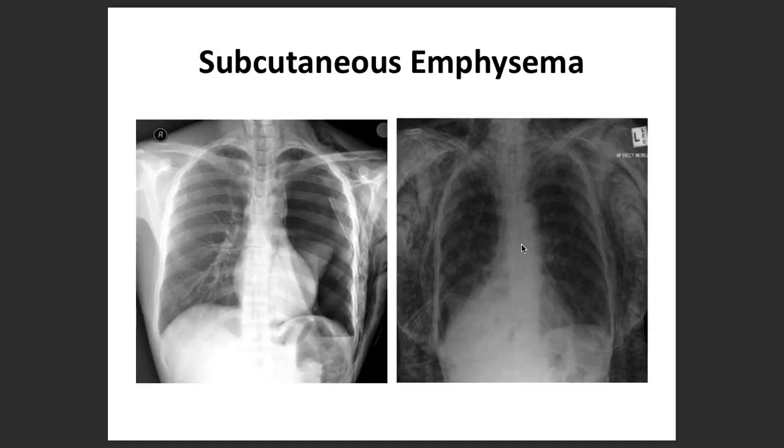Because you can always see those pulmonary vessels as well, those pulmonary pathologies as well. You will be able to notice. So at least you're not expected to be like a radiologist, trying to identify each and everything, but at least try to identify the basic things on which you can modify your therapy, you can initiate your therapy, or the emergency conditions at least.